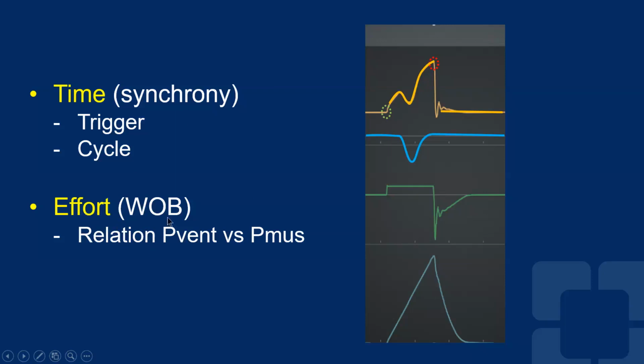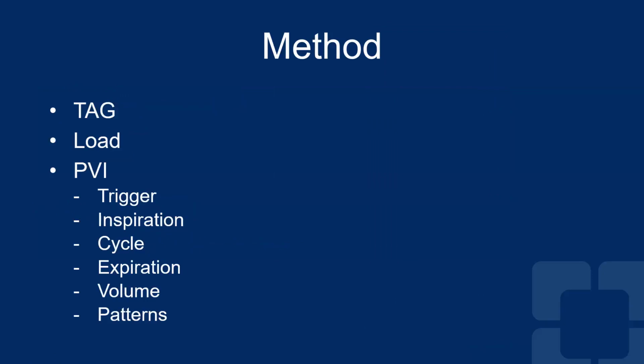So this is the first waveform that appeared on the survey. And there are several like this one. On the top, you see the airway pressure. Let me change the color of this to yellow. This is the airway pressure. This is the flow. And down here is the volume. And this is from a commercially available ventilator.